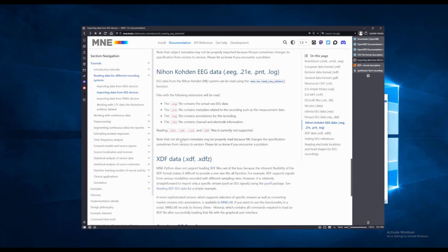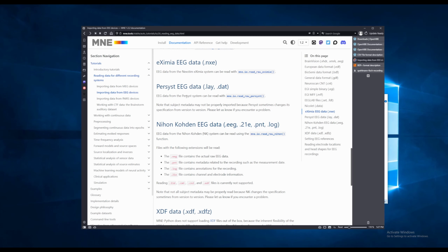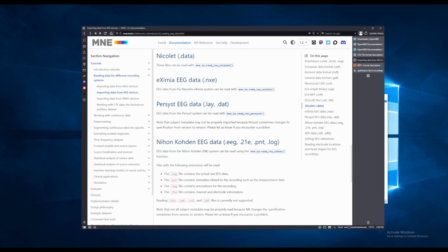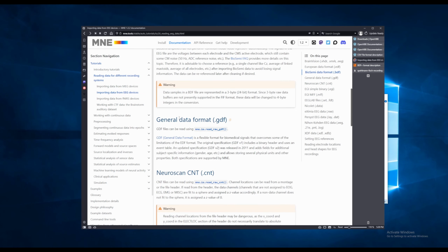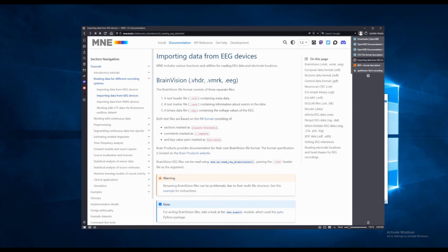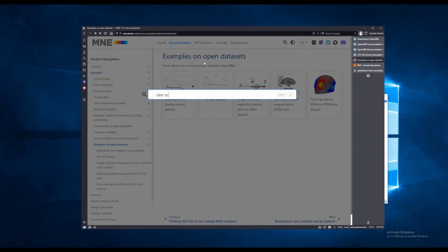But now you have to go and learn another new package that may or may not work as you expect, or look for a converter that can convert your file directly to something that your target environment can understand. But you don't need to worry about that. As long as you have access to the raw tabular information in the form of a CSV file or any other way, and you can extract it from that format, the other formats can use it to build their own raw file, or you can just copy their header and other peripheral information as boilerplate, as you saw earlier that we did. So for example, for MNE even, you are able to build the raw file from scratch. We look up raw scratch.